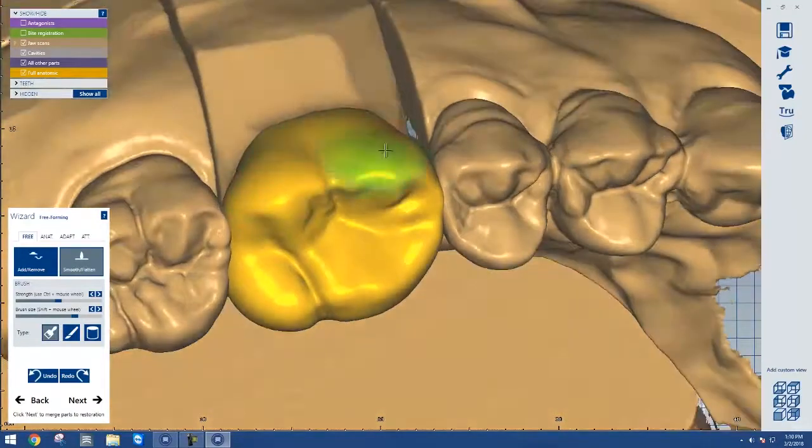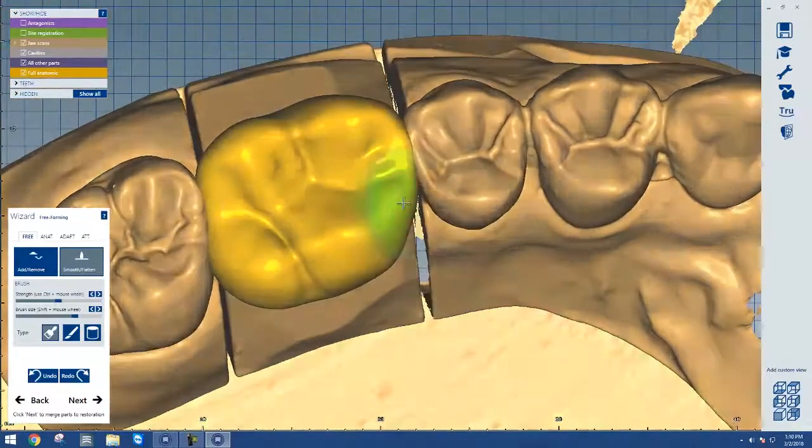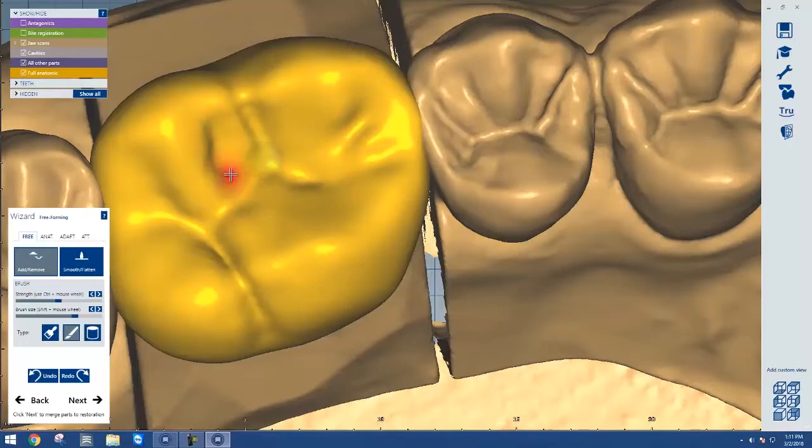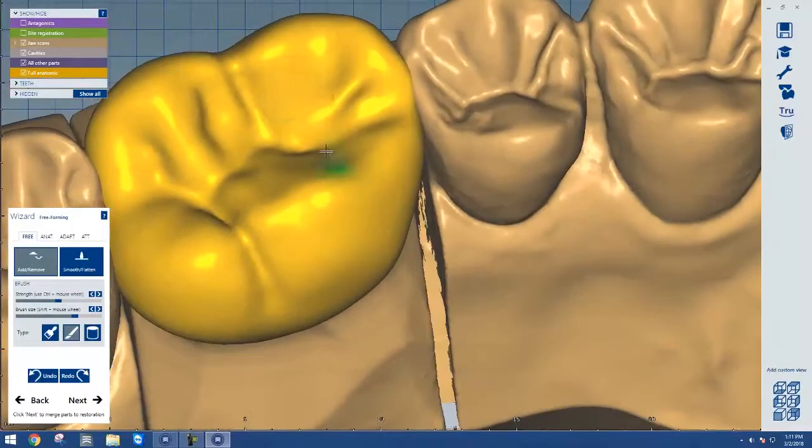When using the point knife tool, you can very easily subtract areas to try and redefine our anatomy, or just accentuate different parts of the anatomy that are already there. If you start to see any highlighted pink or orange areas, that means that the unit is becoming too thin. So I would use the Add tool at a fairly large circle size to add until those red areas are gone.